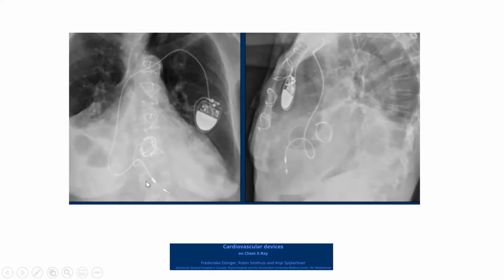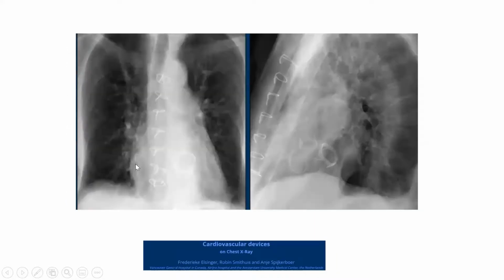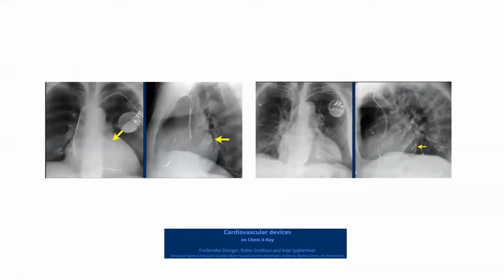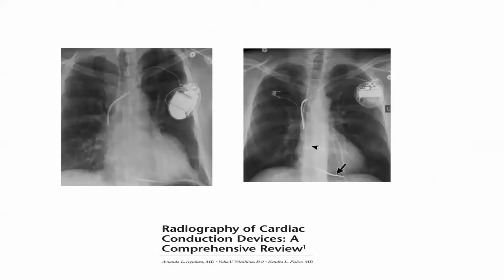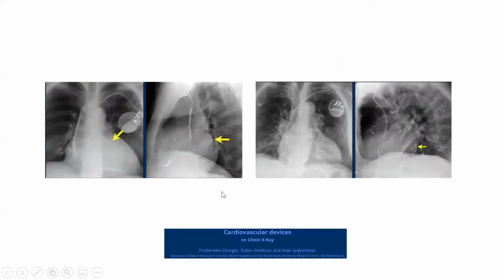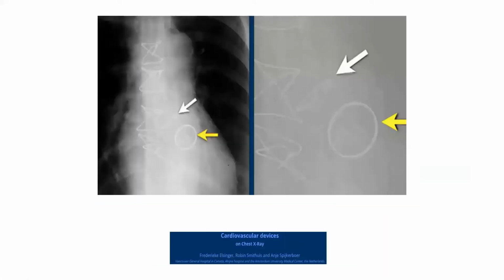No, it's pacemaker. We have shown the difference. There is no coil. The pacemaker, you will always see something like this. I'm taking you back here, okay? Because this is important. You are gonna see coil here and coil here. If you don't see these coils and you just see something like this, this is pacemaker.